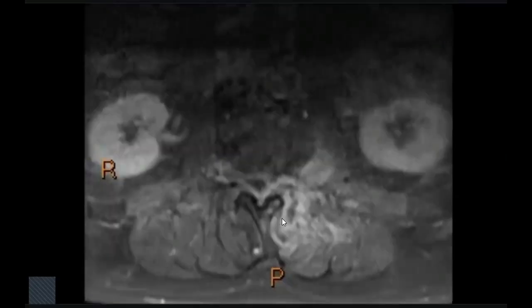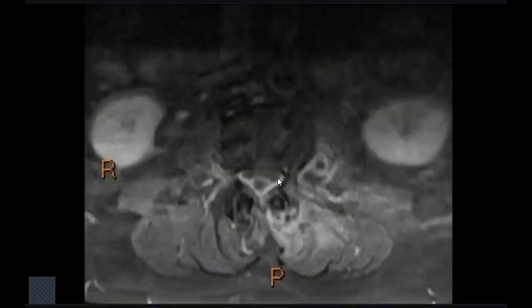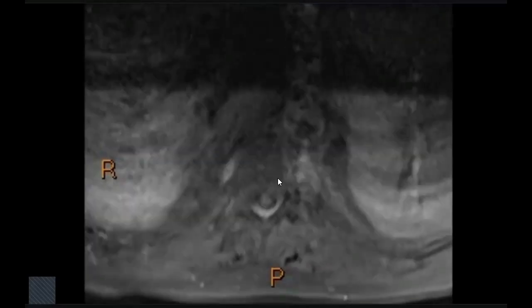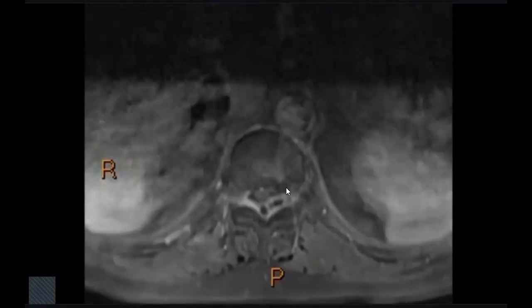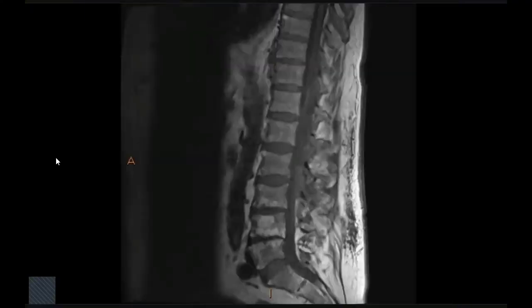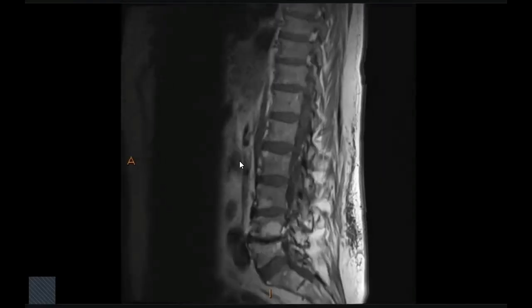Even here the image is not so clear, and here are the cauda equina nerve roots, not so much enhancement I can see. I think they ignored the collection surrounding the cord. This is a common exam case, by the way.